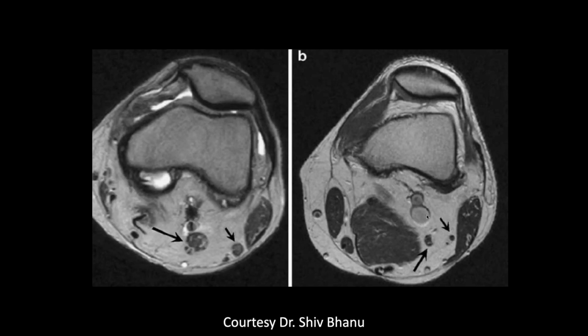Here is another image, and what you can see, these are actually nerves, but they're big nerves, which you can see coming down here. These are where they're becoming a little bit more normal size, a little bit lower down. So what do you think of? We'll see a lot more of this later. What do you think of when you see big nerves?